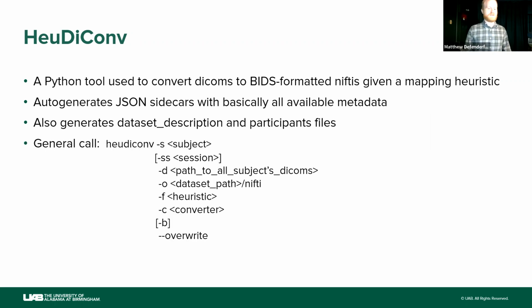We can just talk about what the general call is going to look like before we go into the practical portion. The general call is just the name of the tool. I pronounce it HeuDiConv. I don't know how they want it pronounced, but that's close enough for me. The things that you need to give it as far as inputs go are the subject ID that is going to be inserted into all of the names. If there's a specific session that you need it stored under, you also give it the session ID.